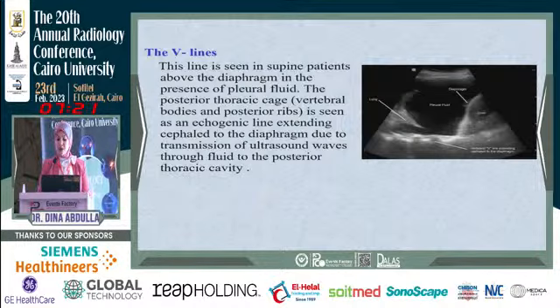Pleural injuries, the most common in post-traumatic patients is the presence of hemothorax. We can see hypoechoic pleural effusion and underlying lung collapse. If it's a long-standing hemothorax, it starts to organize, and we can see septations, and we can see complex encysted components, so it may turn into a septated or complex septated pattern. And here's another case of hemothorax.